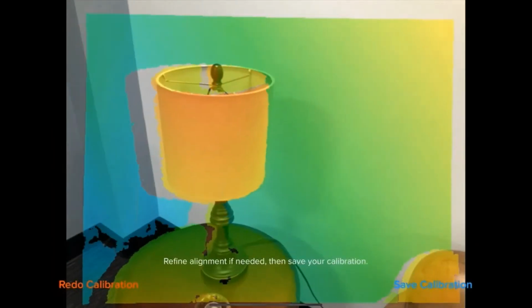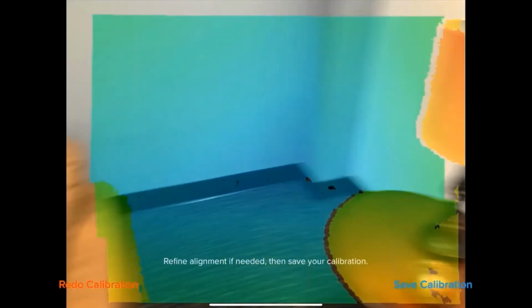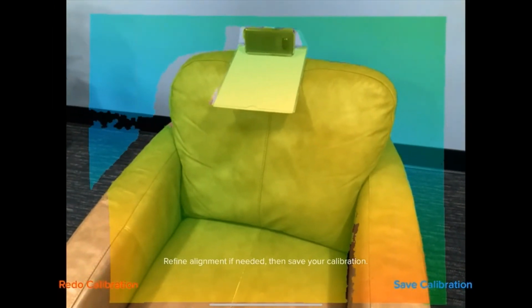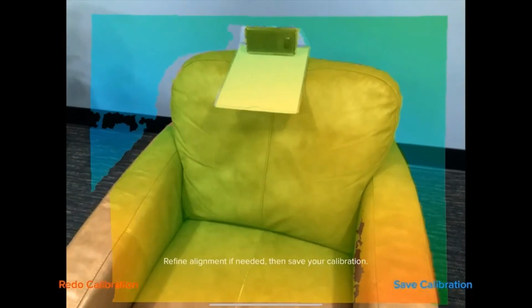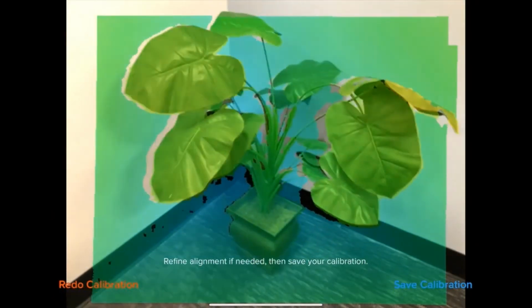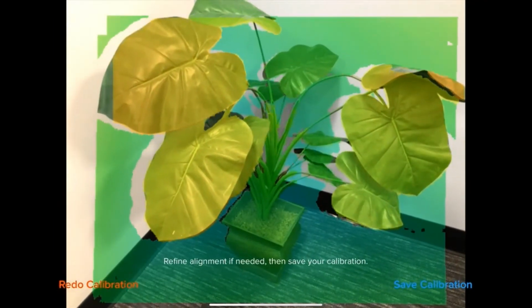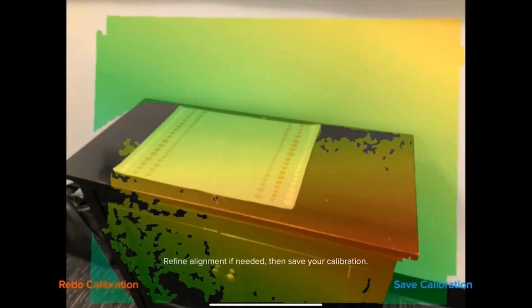We now see that there's a light green, which represents the color depth. What we're trying to do is drag the light green area over the object in the application. So on the chair, we see the edges of the chair in the light green, and we're using our fingers to drag the shaded area over the image. Same with the plant. We're going to take a variety of shapes while we're calibrating using the advanced mode.